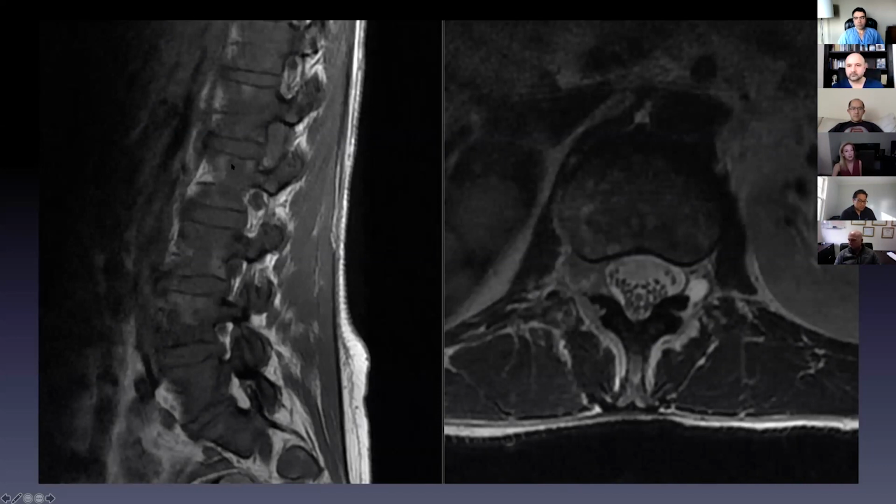So this woman's symptoms, all I got was back pain and radiculopathy, despite her cancer. So what I'm thinking is, okay, maybe she has a pathologic fracture, but radiculopathy, maybe it's something else. Whole spine was imaged, but I thought, I'm going to start in the lumbar spine because that's where I'm going to look for radiculopathy first. Sagittal T1, we look at the neuroforamen from the side. This is a nerve root.